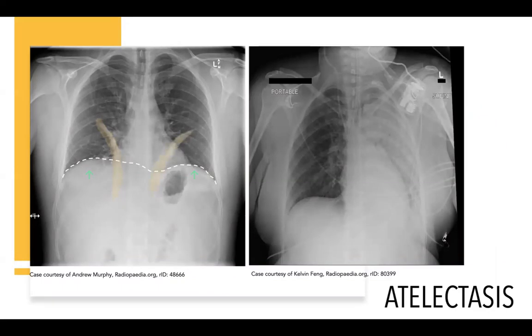Of note, this patient has some sort of pre-existing condition requiring an implanted device, possibly a deep brain stimulator. A right internal jugular central line, diffuse opacities of the left lung. So what happened? A right mainstem intubation. The endotracheal tube was withdrawn, and subsequent chest X-rays revealed resolution of atelectasis and no pathology of the right lung.